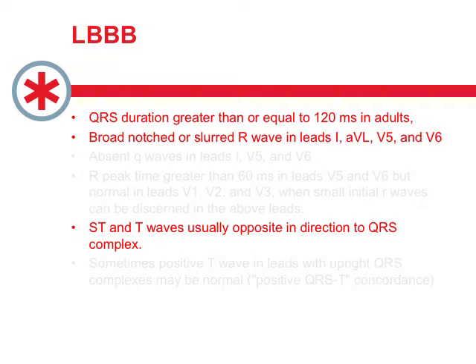When you look at the lateral leads, you should see that really slow extra bit of time of left ventricular depolarization, right? So your lateral leads, 1, AVL, V5 often, and V6 should have a good size R wave, and it should be broad and notched, or have little mini bunny rabbit ears to them. And just remember that because the depolarization is very weird and doesn't go by the normal electrical system, the repolarization of the heart, particularly the left ventricle, is going to also look odd.